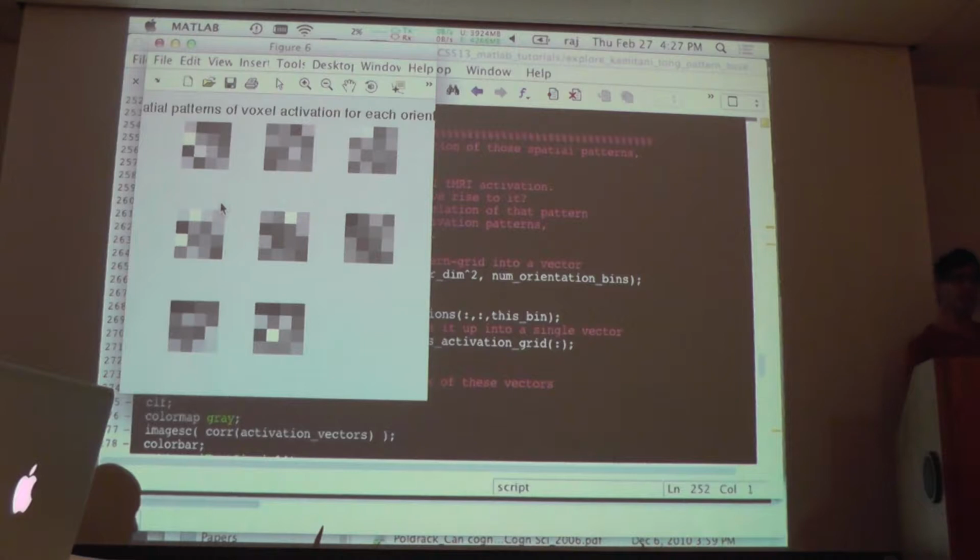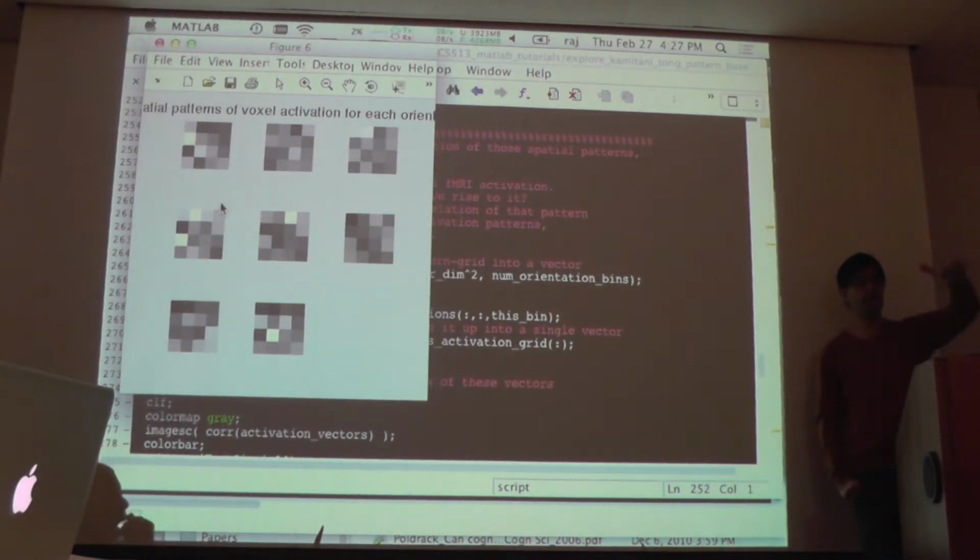If you change the contrast and just look at the activation intensity in primary visual cortex, you get basically a straight line. So you're literally coding for contrast in primary visual cortex purely by activation intensity, which makes a lot of sense because contrast is itself something that comes at different intensities.